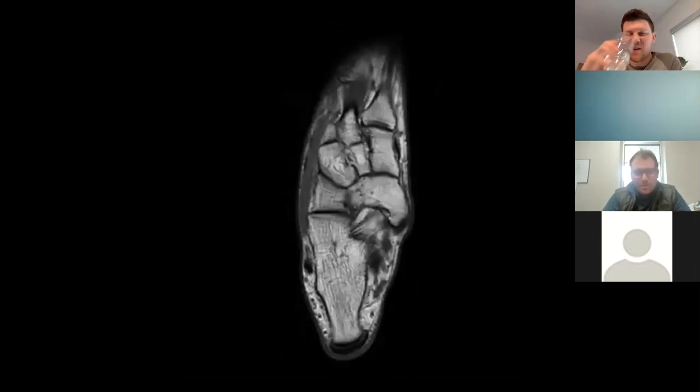Yeah, so who knows what this is? Peroneal trochlea. Okay, so that's a good anatomical landmark when you're trying to figure out where the peroneals are running, right? That's where the sheath divides. That's where you can find those tendons. That's all I got. Nice.